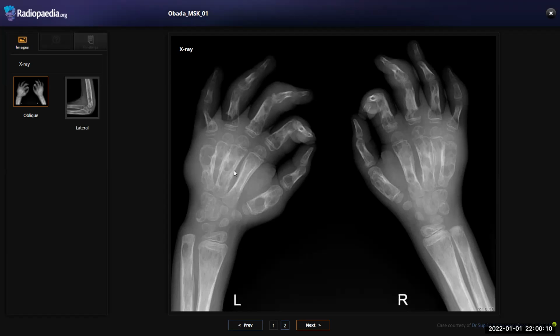The thing about this description, because the patient is immune compromised and these are well defined, you gave a very good differential: multiple enchondromas, but the fever, pain, and soft tissue swellings don't come with enchondromas. Very good, you said sarcomatous transformation. It's one of the good differentials. But in this case, an immune-compromised patient, first you should rule out an infectious cause. This can be done by biopsy or aspiration and acid-fast stains.